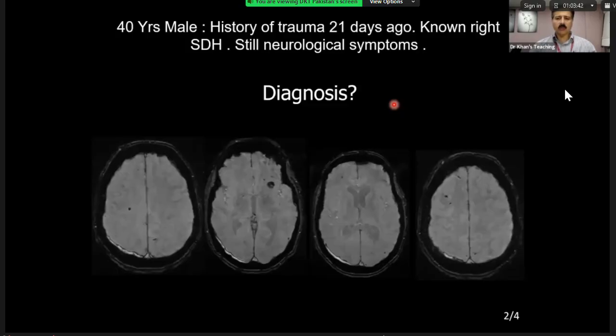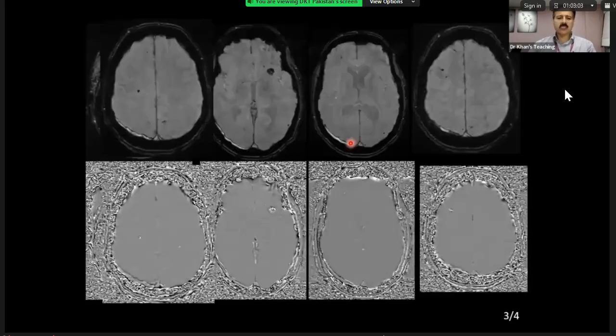What is the location? By the way, the list is more than what I am telling you, but the 4 most common locations are gray-white matter junction, corpus callosum, internal capsule, midbrain. But there can be others also. And you have to see petechial hemorrhages on a CT scan. But diffuse axonal injury usually is not diagnosed on CT scan, do an MR, you do it.